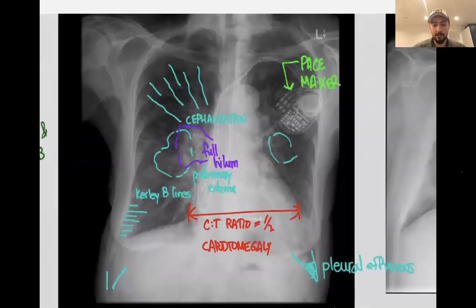Now, the next slide shows the same thing, but highlighted. You can see here, first of all, the pulmonary edema. As you can see, it's very white in here, and you can see a little bit in here as well, some patchiness. And the heart is big, more than 50% of the cardiothoracic diameter. You can see the pacemaker in here, which clearly shows that the patient has a heart problem.